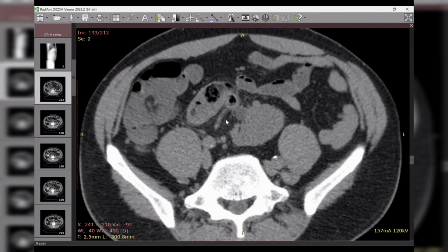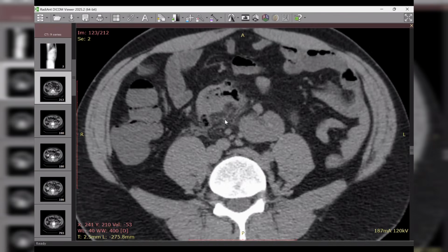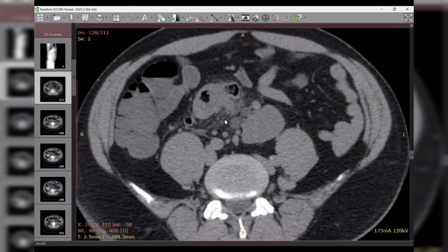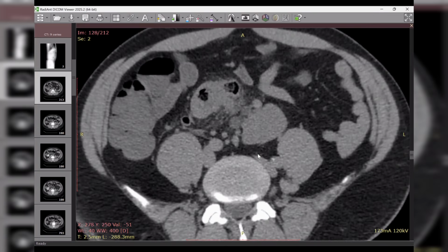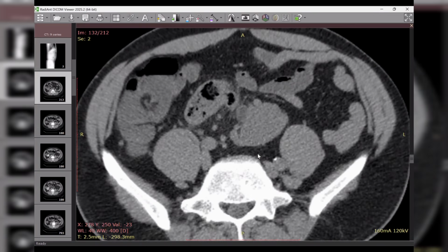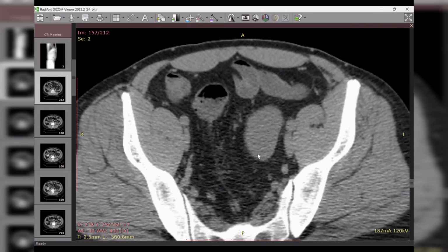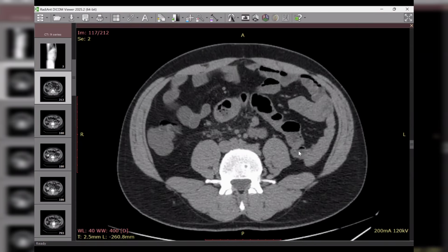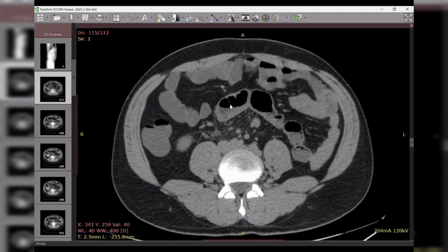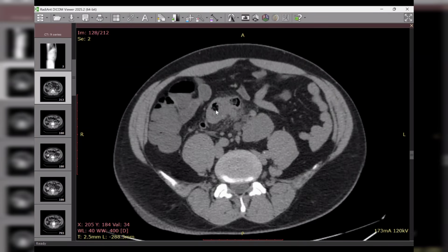I'm not sure which... Let me interrupt you for a second for our colleagues. Which part of the bowel? I suspect this could be the sigmoid colon, probably, but I'm not sure. Excellent. Okay. So this is from here, descending, then sigmoid, then the rectum and the anal canal.